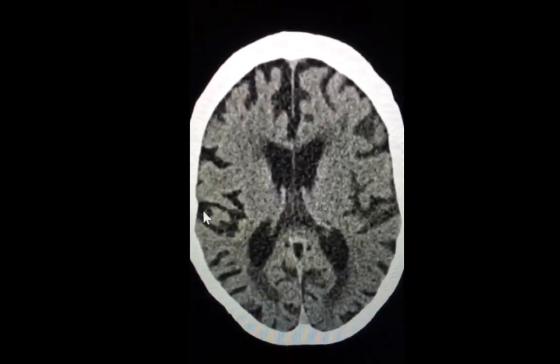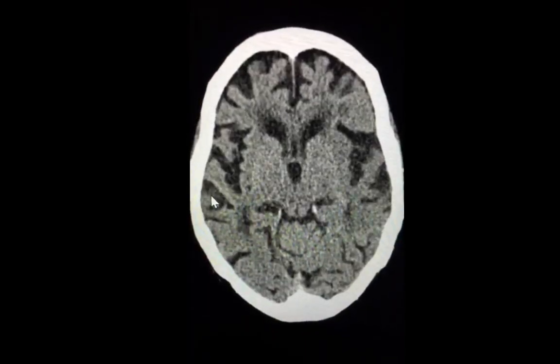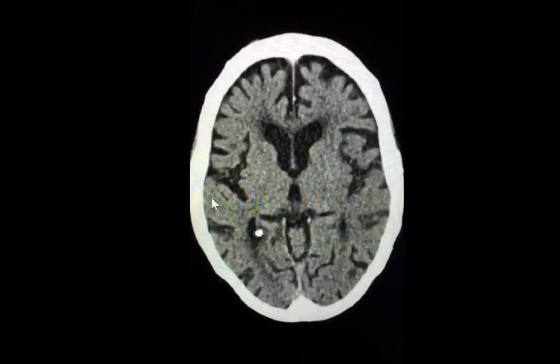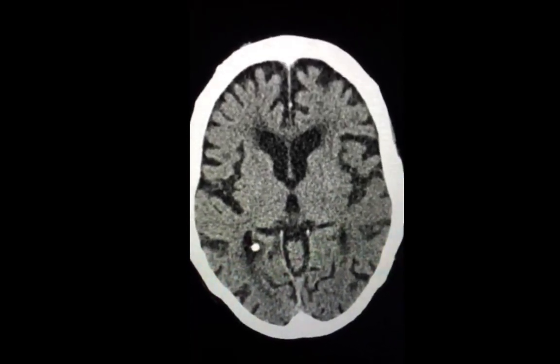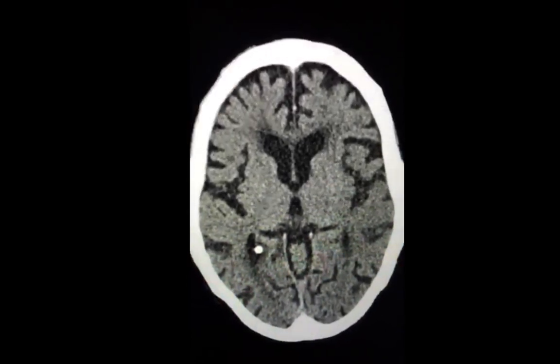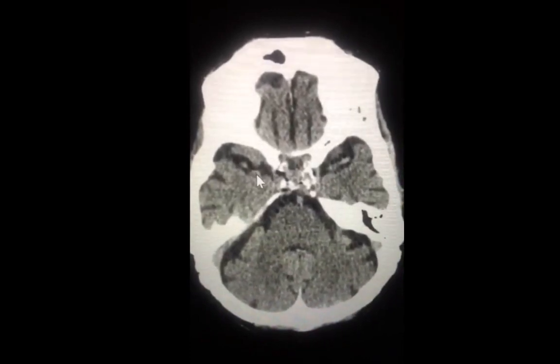before the edema secondary to infarction starts to appear. So even if the patient has a true infarction, the brain CT may appear normal within the first 6 hours of presentation. In such cases, you have to look for the early signs of infarct, and these include 3 famous signs. The first sign is related to acute thrombus occlusion of the middle cerebral artery.